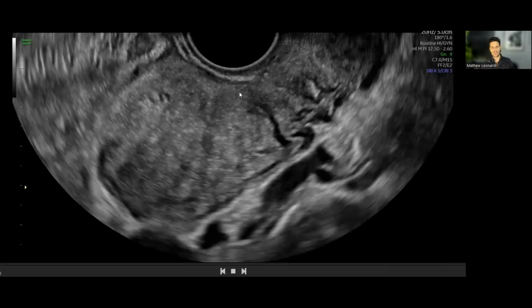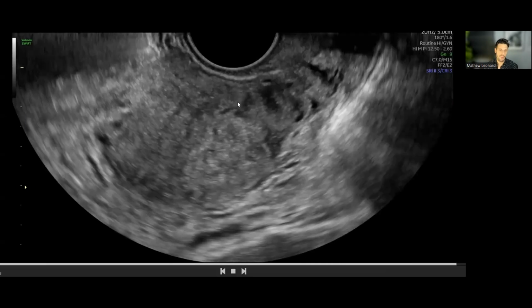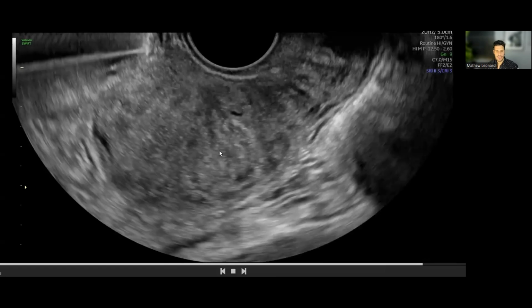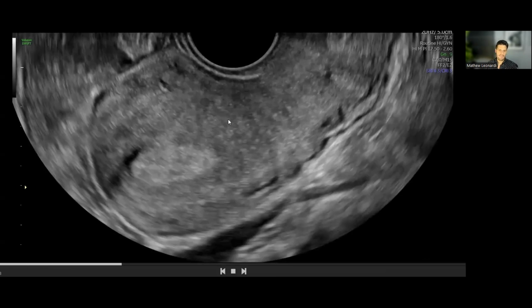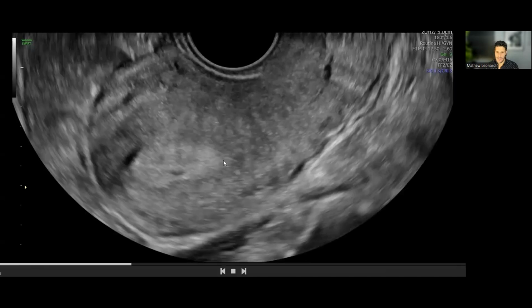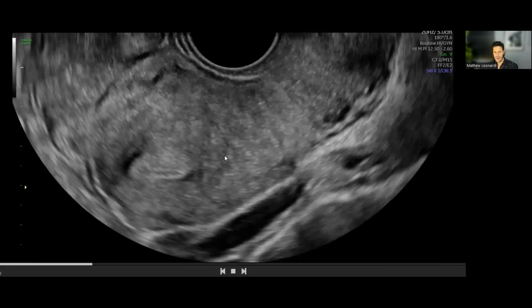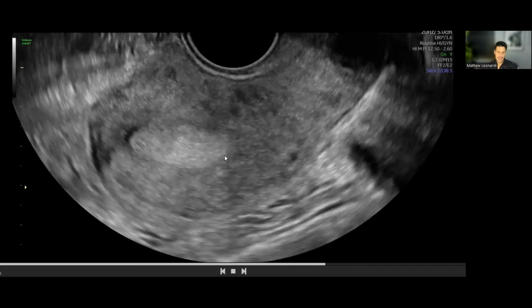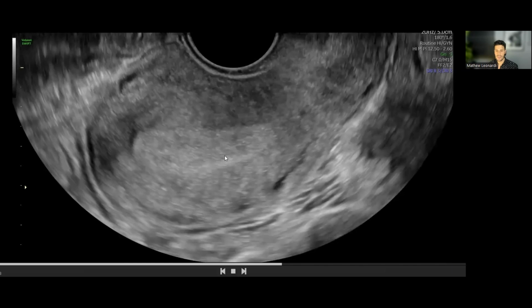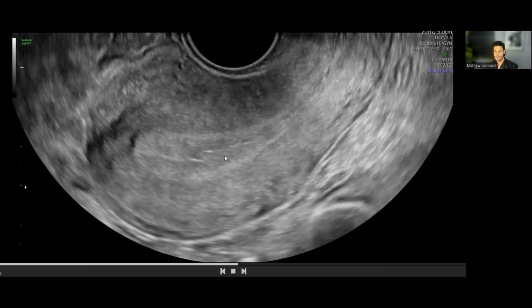So for me, I'm going to report this as quite confidently identified singular polyp in the anterior endometrium, about mid-cavity. It's not a particularly big polyp overall. I'm not going to report second polyp because I don't really have much diagnostic confidence in that today. I don't think that there really are any other abnormalities within the uterus. In the right ovary, there's evidence of a dominant follicle / very potentially fresh ovulation. And on the left side, there's a polycystic ovarian morphology.